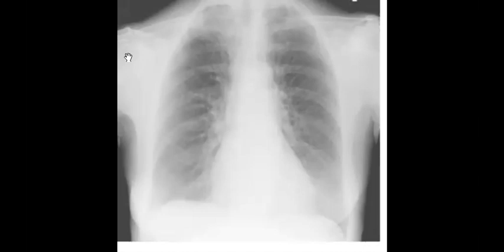Yes. Okay, and the hyperpara, I see Ala take hyperpara. If it is hyperpara, you will search for sclerosis, brown tumors and soft tissue calcifications. Perfect. So the H for SHIRT will be hyperpara. I for infection, like osteomyelitis, if it is one side, but this one is both sides. Rheumatoid arthritis, we already mentioned. Trauma, post-traumatic osteolysis, for the T.